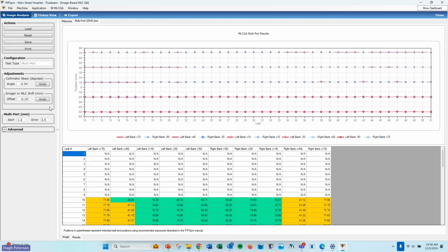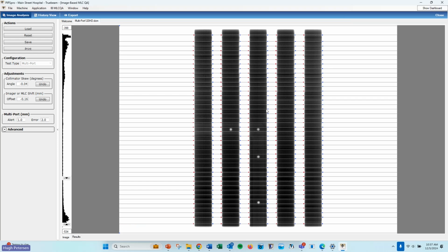And within the software, one thing I didn't mention, for multi-port and then also for your Starshot, there is a compositing tool in the software that lets you composite your images, because obviously you're going to do multiple images of the multi-ports and multiple images for the different axes, spokes of the Starshot, so you can combine those and put those together in one image. But here you're seeing the images for the 5 different ports. You do see some fiducials here. This is actually kind of a leftover.